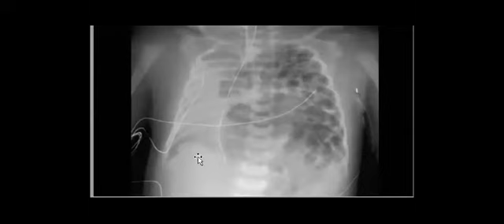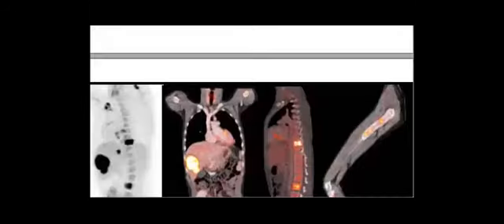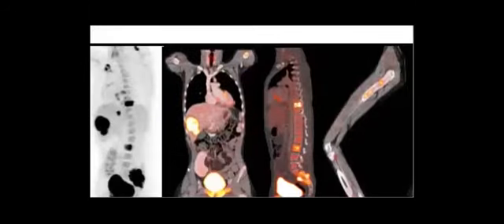I want to show you two cases before we forget our PET-CT hybrid image, just to continue what we mentioned last time. Okay, so we'll try to make some refreshment every time until you are used to this type of images. Try to describe, and with these multiple findings we can put a differential and reach a final diagnosis.